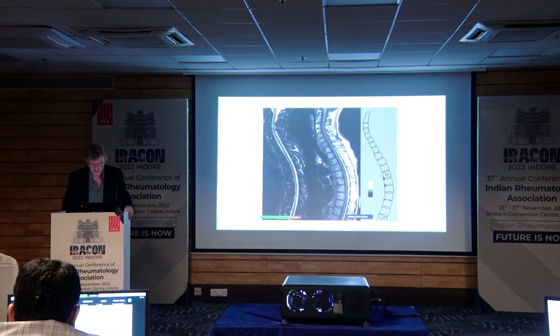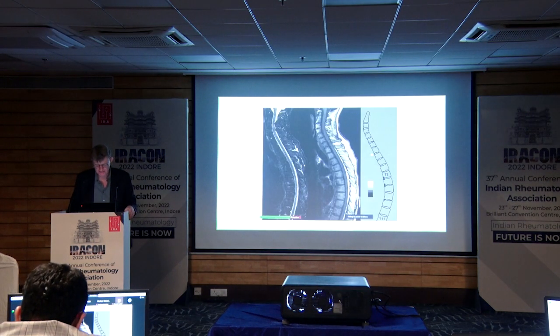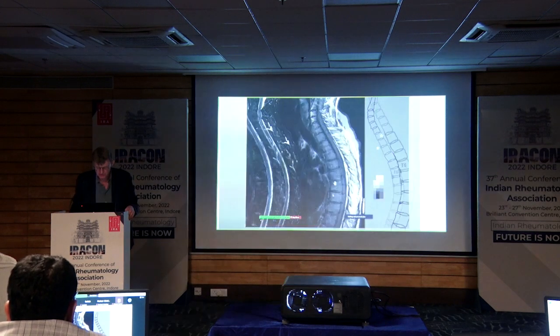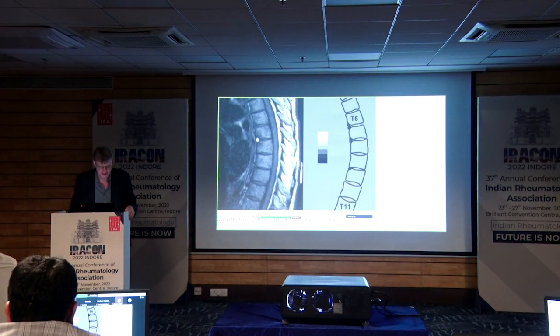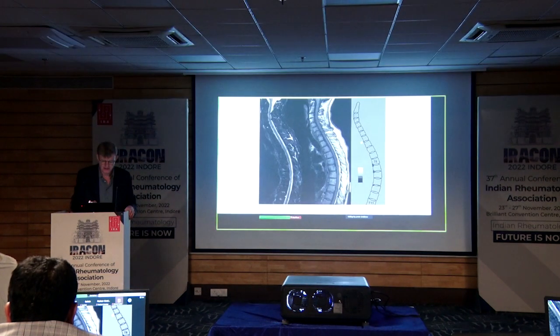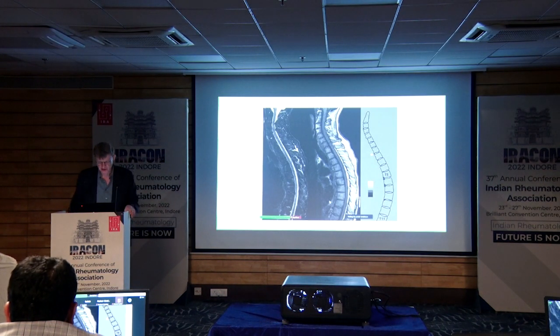Bone erosion is not so important. It looks like the same as the other where you have holes in the bone. You can see it here, that some of the bone is missing here. Oops, it goes around here from here and there. But they're quite rare. It's the fat infiltration, the new bone formation, and the inflammation which is interesting.